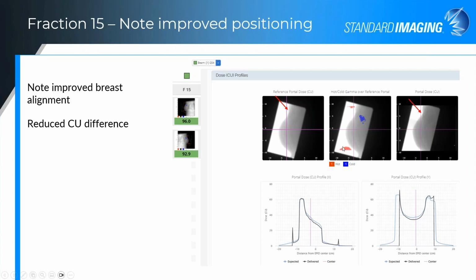And this can be just related to the panel calibration or what have you outside the breast in air. So basically, one area that I'd like to focus on is the inferior aspect. And you can see I put a circle here where we're at -10 on the scale. Because of the magnification and not being able to fit the whole portal on the panel, it's clipping just the portal image, the inferior aspect of the breast.